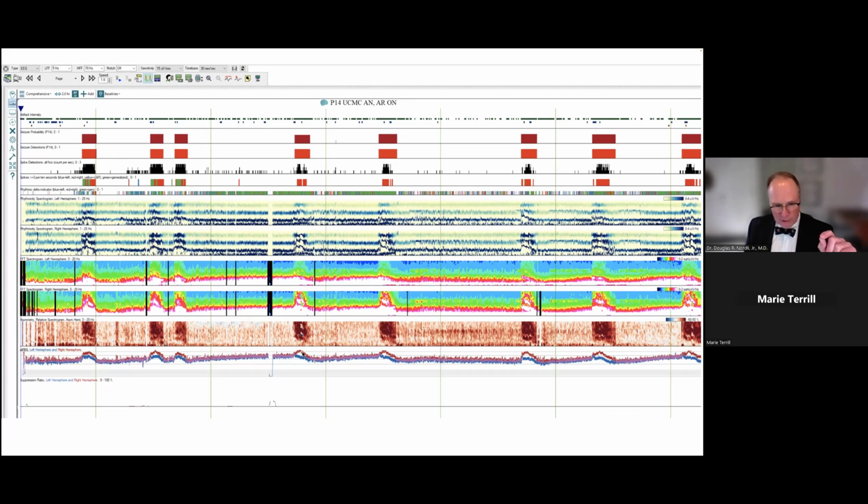So the red is right, the right trend is higher here. And if you look up just above in the asymmetry spectrogram, it makes sense. There's more red again, indicating more right-sided activity over here across the frequency bands, more power across the frequency bands there. We go up here, we see the same thing on the FFT, the fast Fourier transform spectrogram.